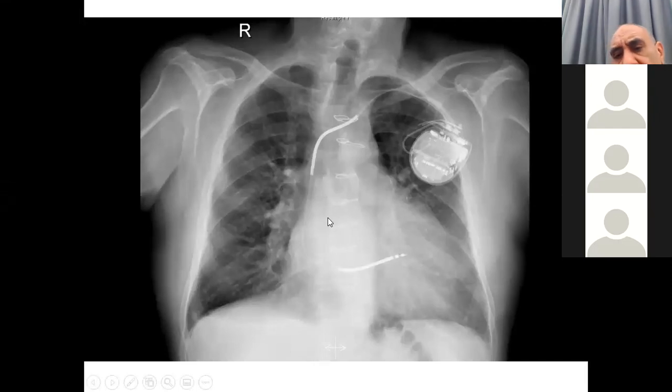And this gentleman explained for us how medicine or cardiology has advanced. It is believed now that TAVI prosthesis is considered one of the best advances in cardiology over the last 10 years, because it allows so many elderly people to receive the TAVI prosthesis for their significant aortic stenosis without the need for surgery. And this is a defibrillator. We said it is a defibrillator because it has a thick coil, not a thin coil. And this is the sternotomy wires. And this is the TAVI prosthesis at a closer look.